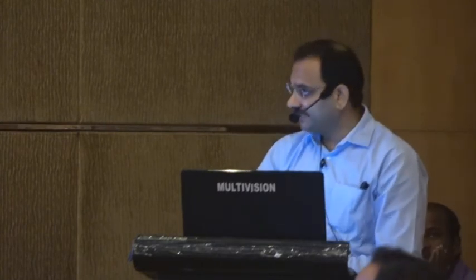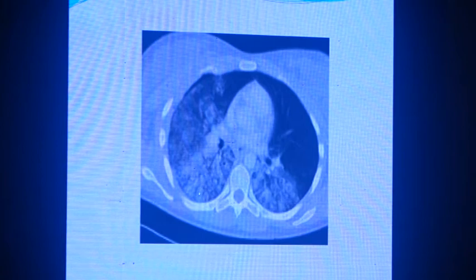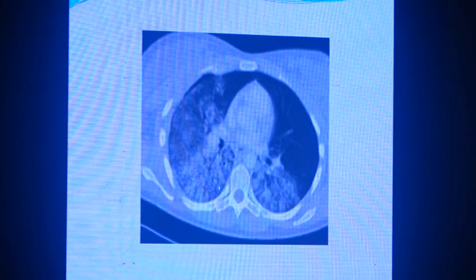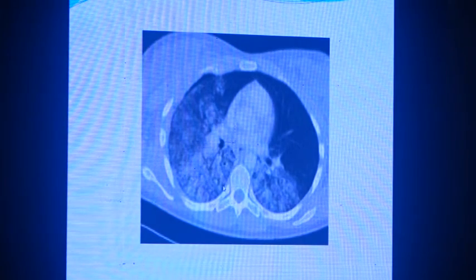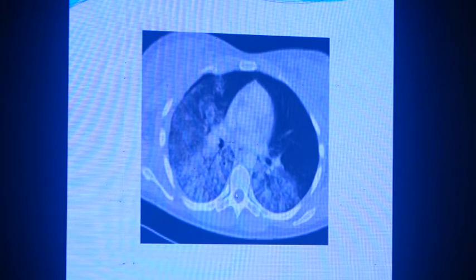So we are looking at the CT slides of a trauma patient. What is the next trauma finding? Contusion. If there are lung opacities like this, it will be a lung contusion. Most lung contusions occur at the periphery, because the peripheral vessels rupture and they develop some effusion as well as contusion. So contusion will look like this hazy opacity in the CT chest.